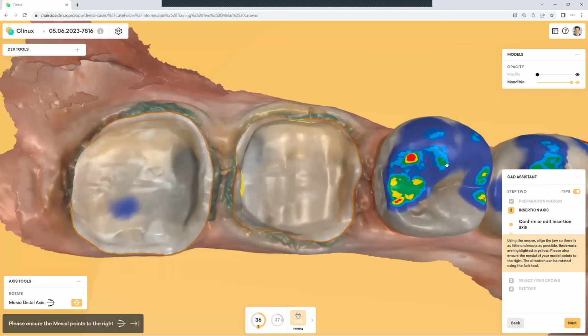I'm always worried that I'm too thin. And so when I'm in this positioning step, I like to have a little bit of red in the contacts because I can always bring the cusps or the marginal ridges down. But it's more difficult to do the other way around, which is to bring the fissure up, so to say. So you can start with the cusps a little bit high and then use your circular shape tool to bring those down in your next step. So let's just go ahead and click on next, and we'll get our crown proposal. And we'll work on these high spots, okay?